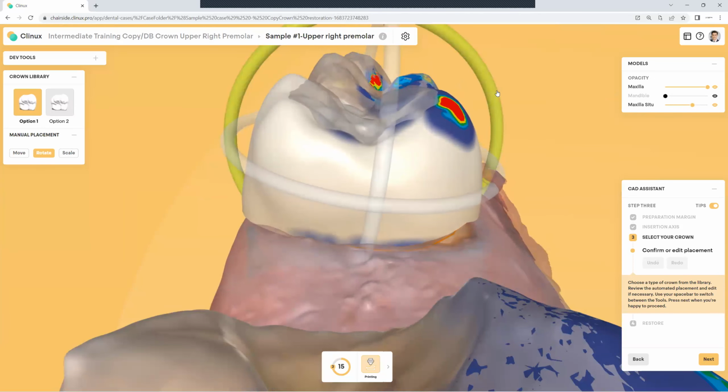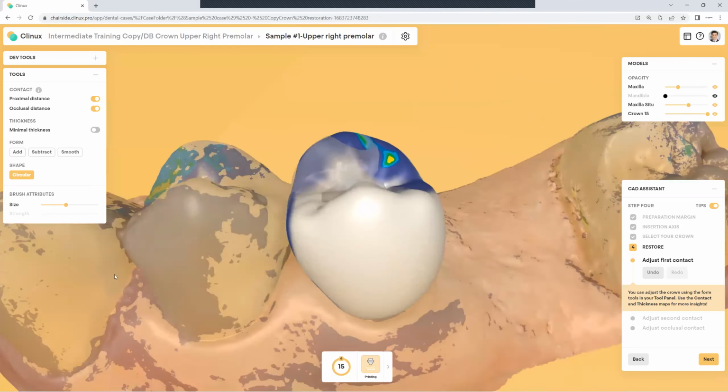So I'm going to take the circular shape tool. I'm going to make it big so that I grab that whole lingual surface essentially. And now I can drag that cusp exactly where it was in the pre-op. You see that? Now this guy's a little too fat down here, so we can give him a diet. Look at that. And now I can always also see the previous lingual surface of the preoperative tooth. And so now that whole lingual is almost identical to the pre-op situation.